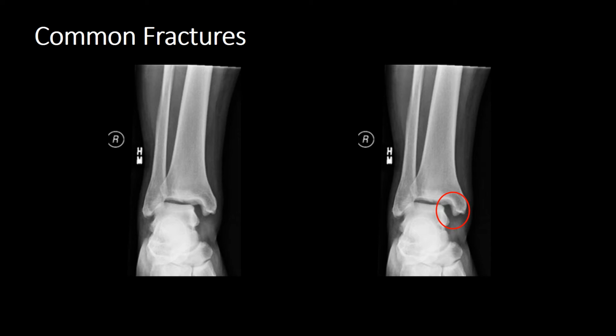I've touched upon this earlier in part 1, but we're going to now look at this in a bit more detail. We can see that there's no evidence of a fracture. The fibula is intact, as is the tibia. And yet, when we look at our mortise joint, and our normal mortise joint should be 4 millimeters or less of the medial, superior and lateral clear space. And here we quite clearly have a diastasis of the medial clear space, so it's more than 4 millimeters. Therefore, we know there has to be a further injury which has allowed the talus to shift laterally.